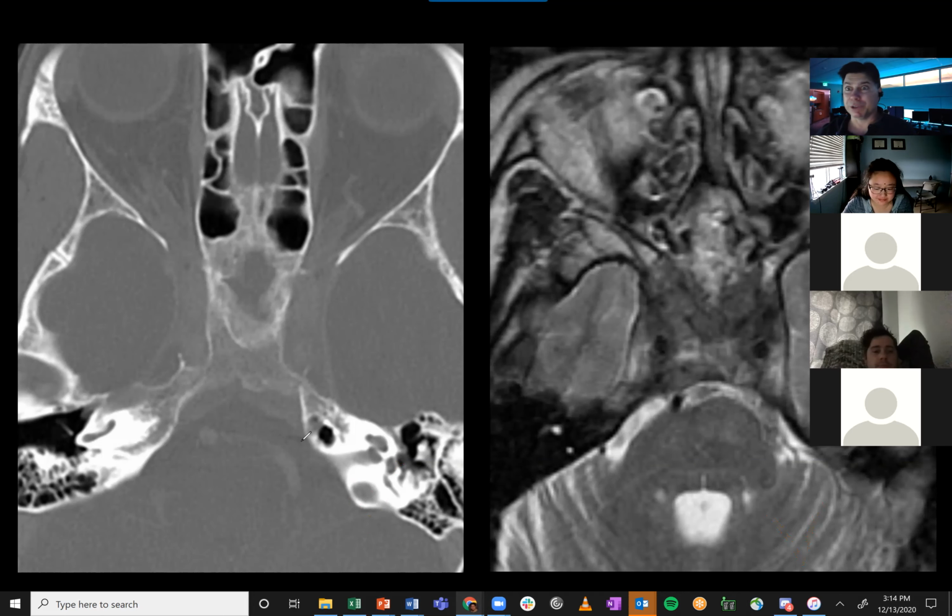Now, remember, not all of these are kind of Aunt Minnie. Sometimes it's just a discussion about what it could be. Okay. So what do you think about this stuff here? And this here? Okay, so it almost looks like it has a ground glass-like appearance. It's centered kind of ground glass, but if you say ground glass, everybody's going to start thinking fibrous dysplasia, and that's an intrinsic osseous expansile thing.